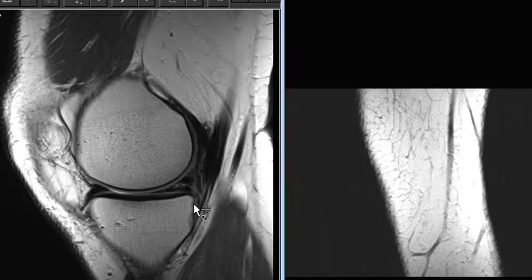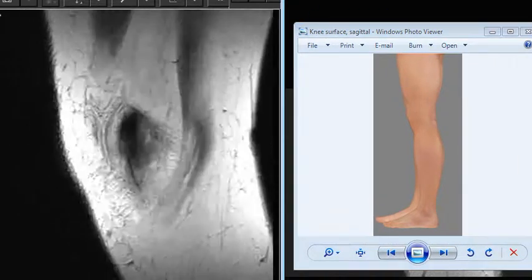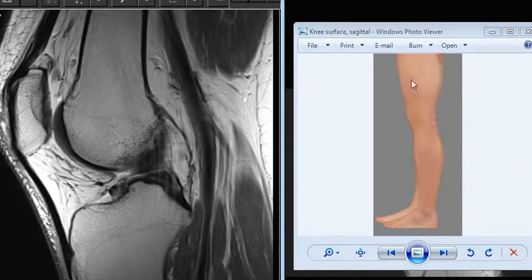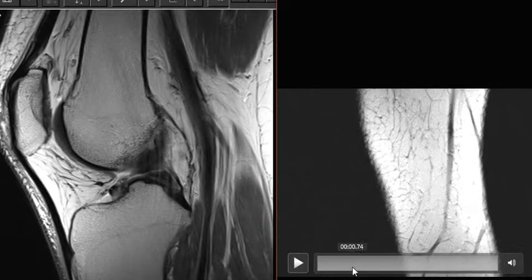Hi, let's look at your knee MRI from today. So we're looking at your knee over here on the right, on this image on the left, and we're looking at it from the side view, somewhat like we're looking at this. Okay, and on this image we're looking at a normal for comparison, so we can compare one thing to the other.